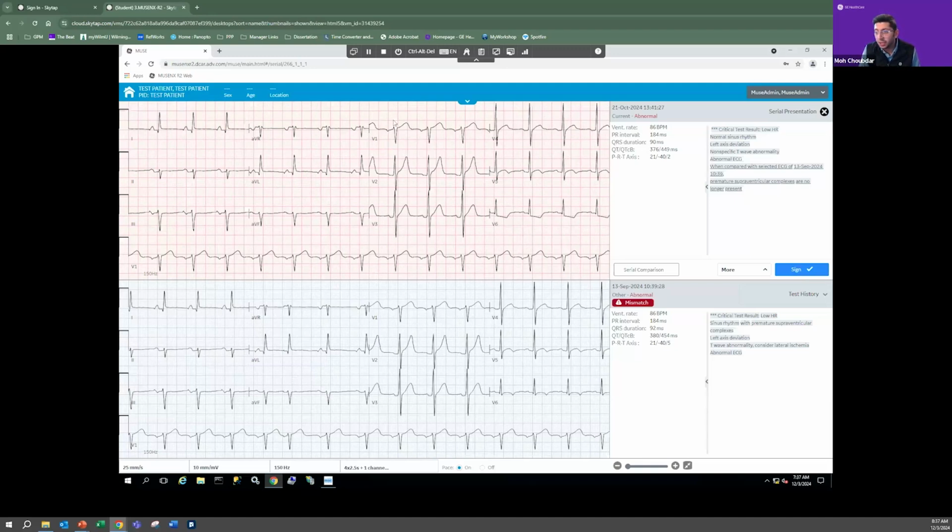But let me ask you this. Would that be something that you guys want? That whenever you update the patient demographics, it does an automatic serial comparison? And then would you want it to be associated with the buttons, like for example, update or demo complete? Or would you want it to be always updating or doing the serial comparison automatically whenever the patient ID has been updated? And doesn't matter what you press after, whether it's update, demo complete, diagnosis complete, fellow confirmed. I'll leave that to you to answer.